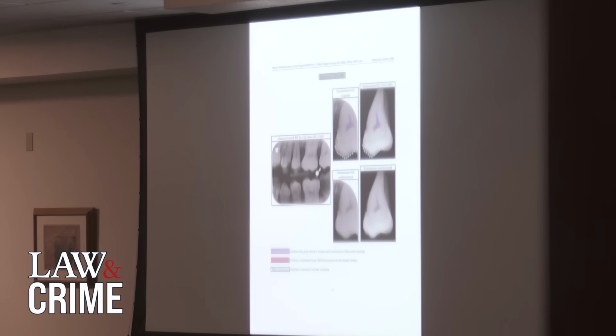And in this case, I just highlighted the pulp, which is that pink dotted line, highlighted the mesial cusp on the occlusal anatomy, which is that white dotted line, and then just showed the decay, which is that red circle there.